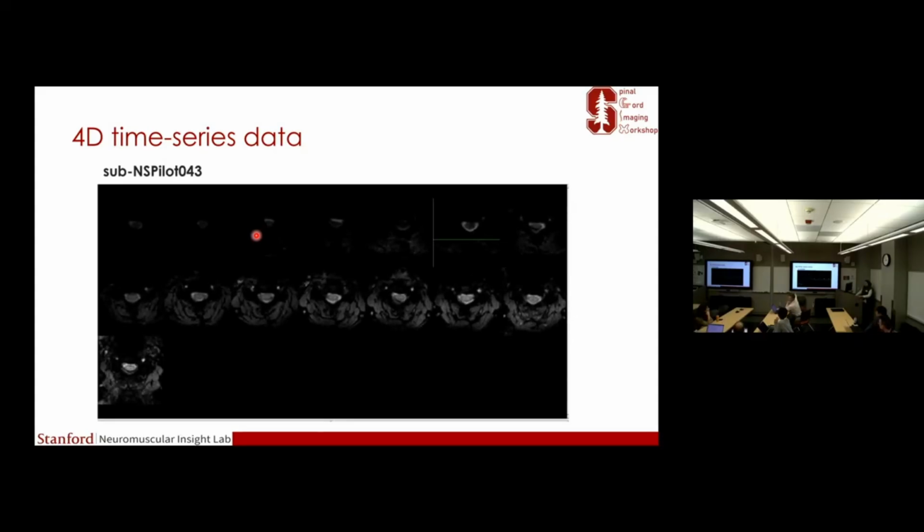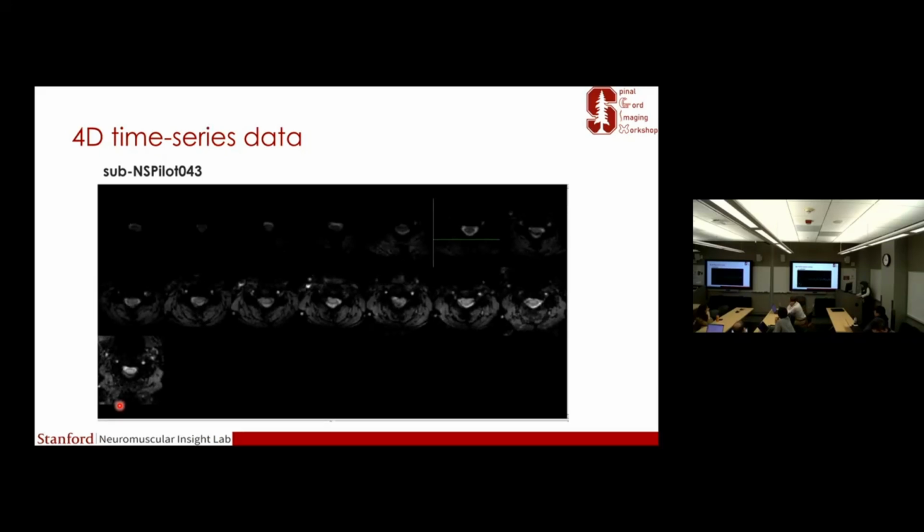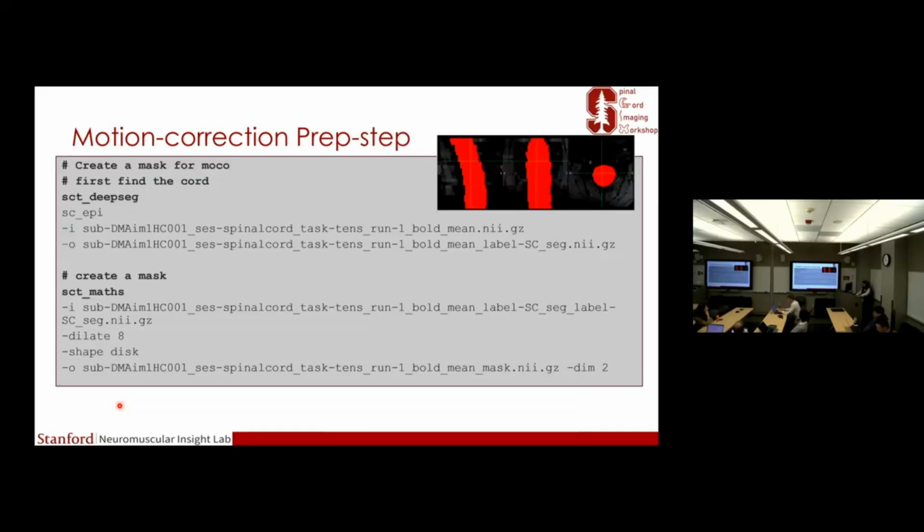That artifact's, I think, just the video, right? Yeah. The lower left. There's a flicker there. That's not in the time series. Yeah, you're good.